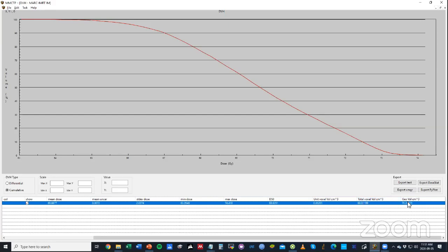And then you can see calculating the volume of this structure based on the coordinates from DICOM and calculating an area per slice and then adding those areas up for all slices, it'll give you a different geometric volume.